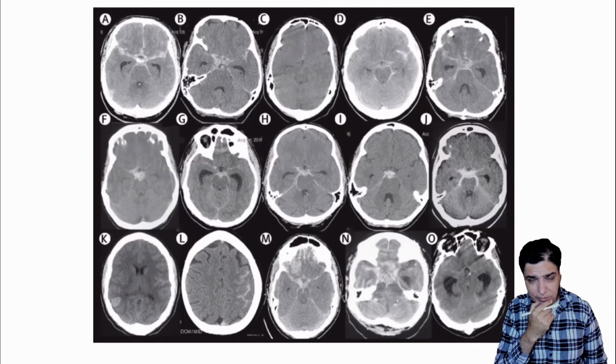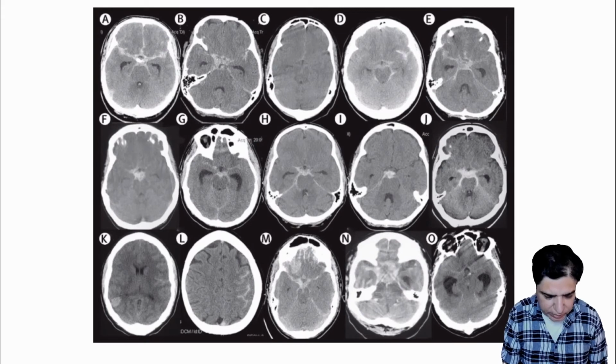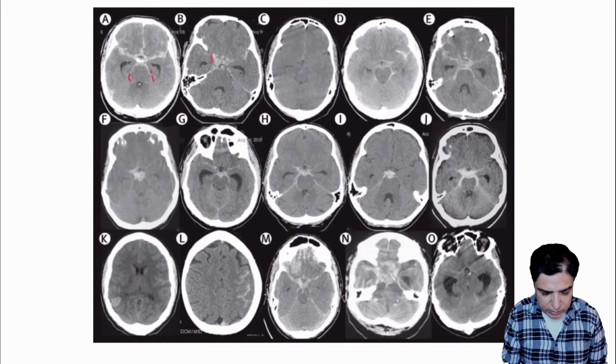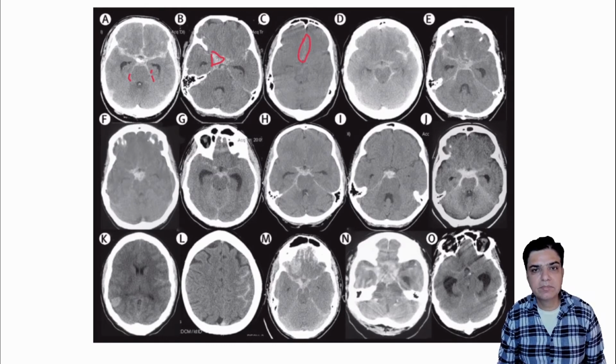Here I would show you different images, and let's start from the top one. In the top one, if you see, there are a few bony shadows, but then you see that there is infiltration of white in different spaces. It's probably subarachnoid hemorrhage. Here you can see another area where it's infiltrating inside. Normally you shouldn't be seeing any such shadow. Again, subarachnoid hemorrhage. Here you can see a bit of whitish shadow extending where normally you would be seeing some blackish, and that is subarachnoid bleed.